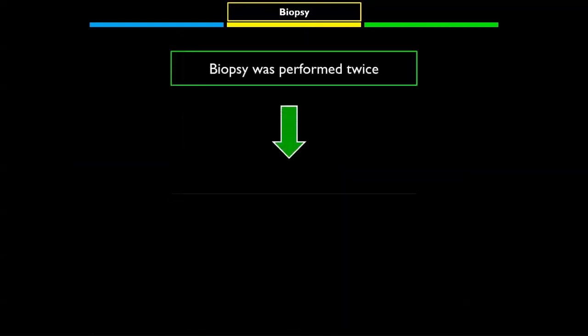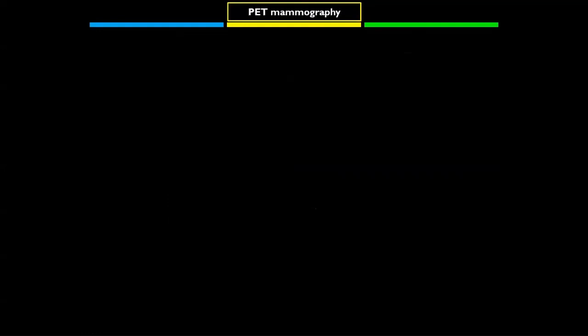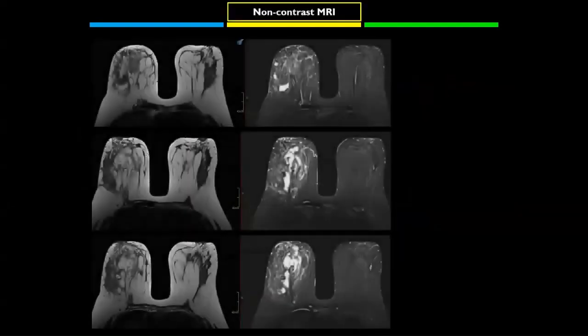And you remember that she was biopsied twice because her clinician was never satisfied with the diagnosis based on how the lesion looked on the MRI. And she was sent for a third biopsy, but actually I refused to do a third biopsy. And he insisted that he needs a PEM, or PET mammography. And actually it was more deceiving than the MRI because it gave us values which were just similar to a malignant breast lesion.